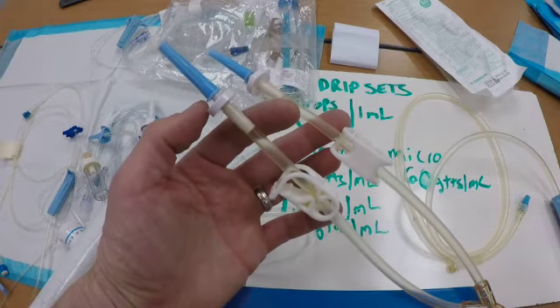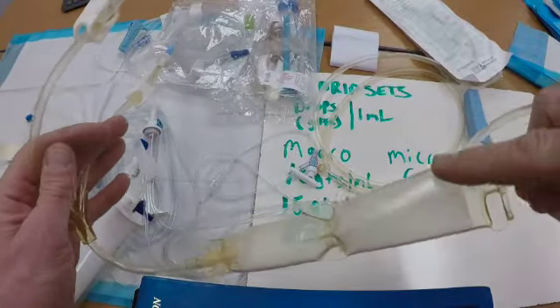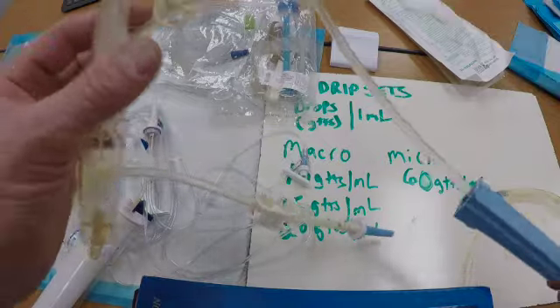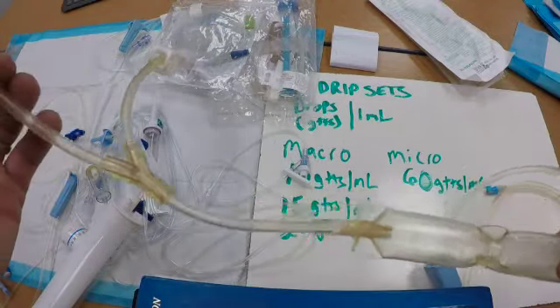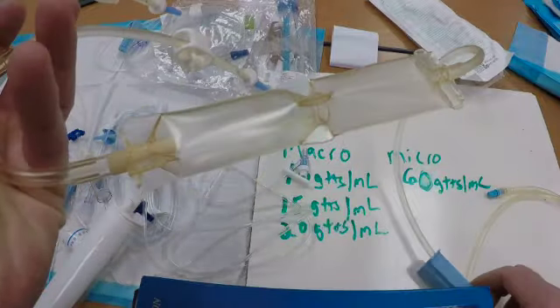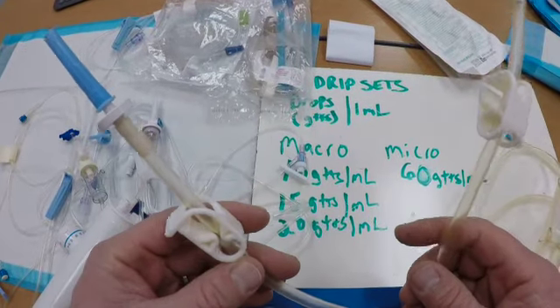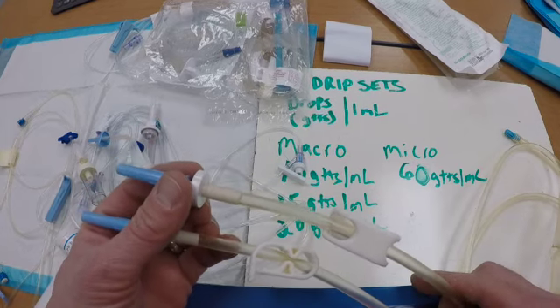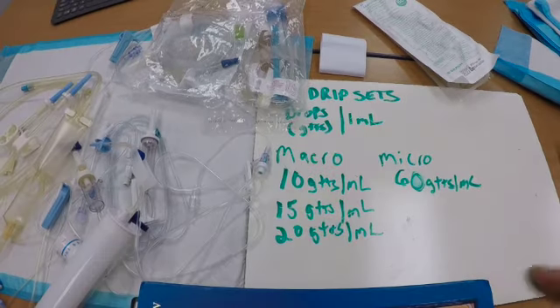So we're going to spike a bag. We're going to fill this section completely. We'll go into more detail about how to do this later. So that this is like a pump, and this is the widest bore tubing, so we can get the most volume in. And so one of these would be connected to your saline, and then once that's been running, you would connect blood tubing to this. Lots of very exciting things coming with EMS blood administration.